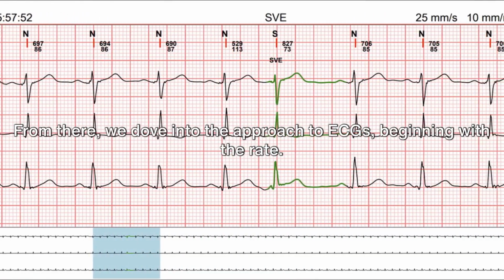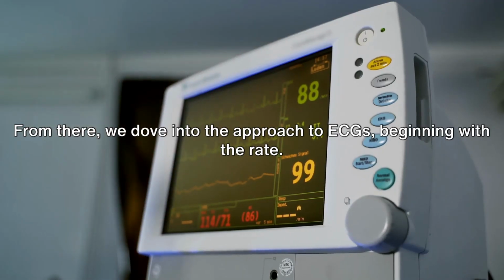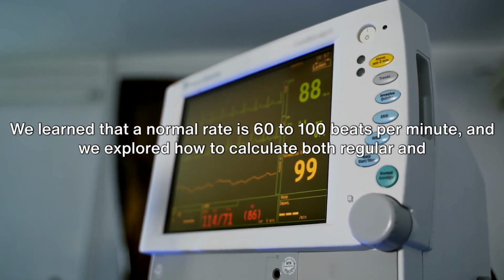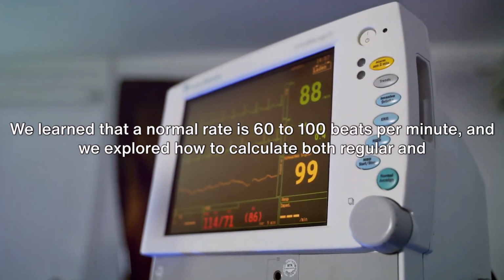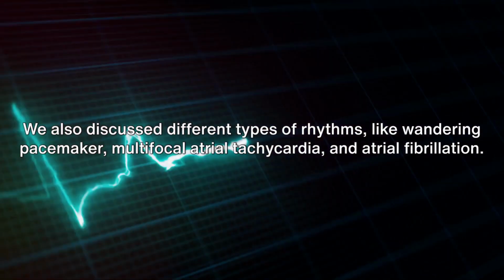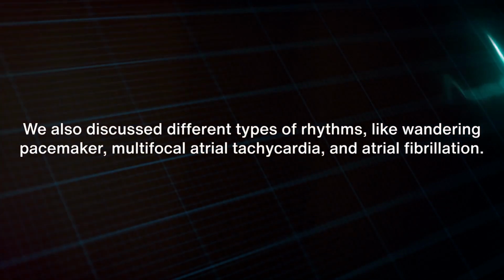From there, we dove into the approach to ECGs, beginning with the rate. We learned that a normal rate is 60 to 100 beats per minute, and we explored how to calculate both regular and irregular rhythms. We also discussed different types of rhythms like wandering pacemaker, multifocal atrial tachycardia, and atrial fibrillation.